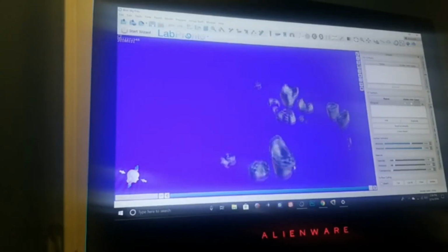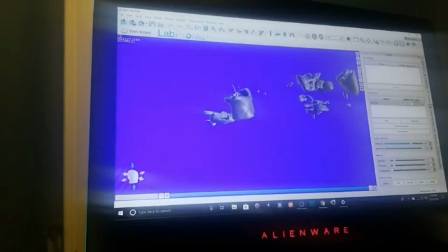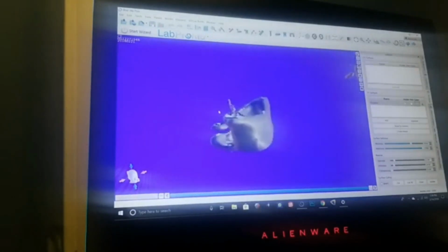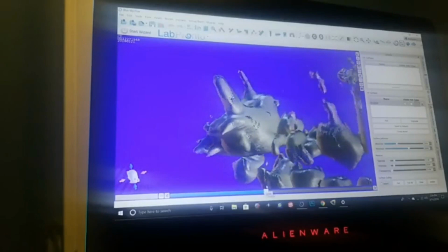What are you looking at here? You're looking at fillings, you're looking at crowns. Why? Because the metal is much denser, and you're looking at the post. Take a look here. You see the post on the crown? This is much, much denser than the bone is and much denser than the tooth is. As I'm now increasing my density, everything is coming back. You're rebuilding everything.